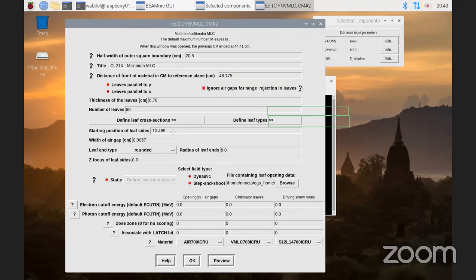Right. I see you now. Okay, so I was adjusting because, suppose this is your isocenter, the distance from the first leaf to the isocenter is this value, and I can always change it with the beam. That's not a problem. So what I've done is try to manually fix that value so that I get the edge of the 10 by 10 field on one edge to match the jaws.